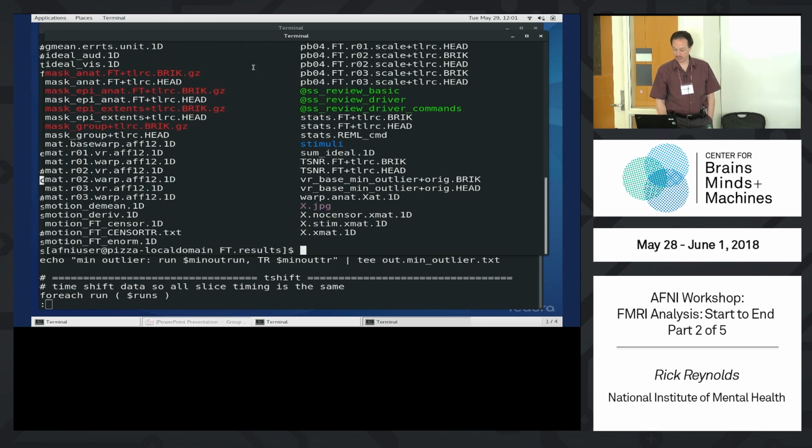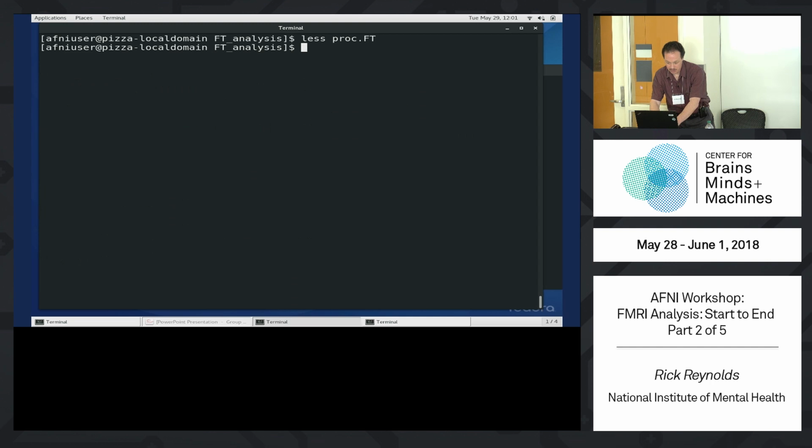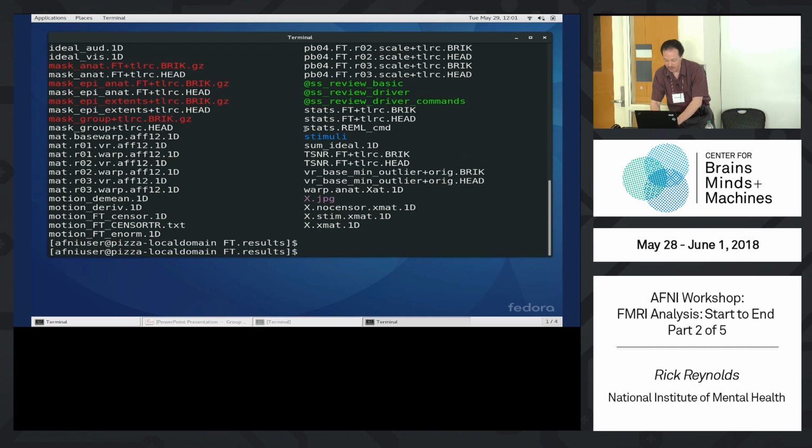So let's see what we have here. We have a whole bunch of stuff. Maybe I should, did I write a title option? Title, hello. Nope, I didn't make a title. I should do that. So I'm just going to hide that window for now since my black background makes it a little confusing.